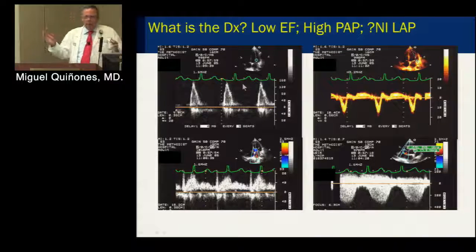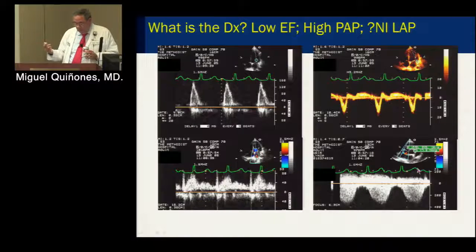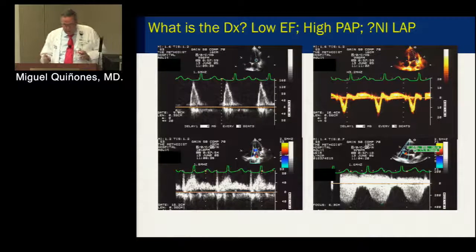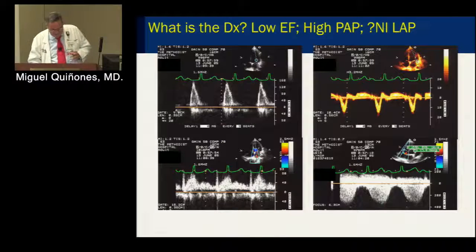So we have a very long PR interval. I have no idea what the filling pressures are. This is one where you say, I don't know. This is not an E prime, this is an A prime, because it's an A. Pulmonary veins look okay, and PA pressures aren't okay. So this could be vascular pulmonary hypertension with normal filling pressures. Here you need some more help. But what condition gives you a lowish EF with a long PR interval? Sarcoid, yeah. So this is a patient with sarcoid, of course. There we go.